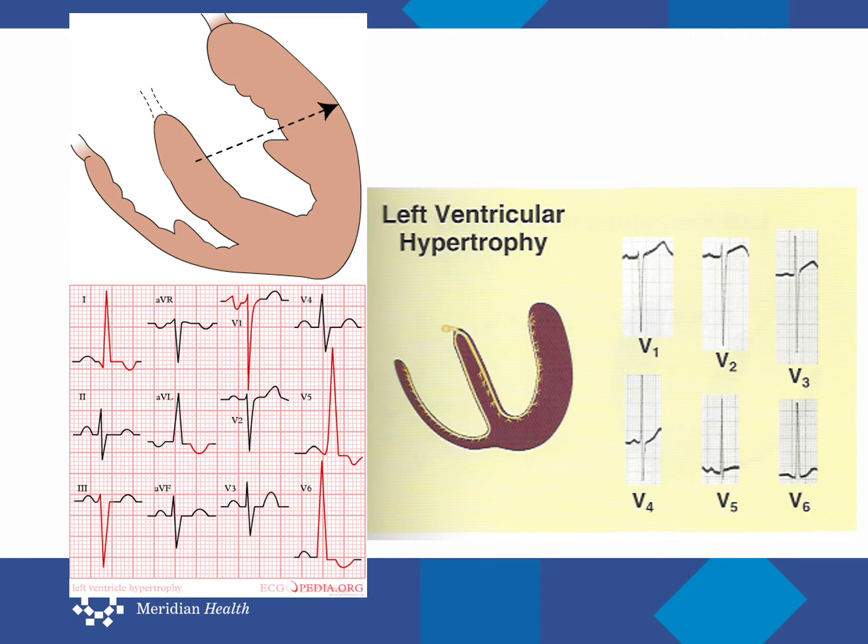Here are two images which tell the same story. When the left ventricle is hypertrophied, as it might be from pumping against an increased afterload in chronic hypertension or in valve disorder, the hypertrophied muscle is reflected in increasingly positive deflection towards the left. More myocardial cells on the left are depolarized.